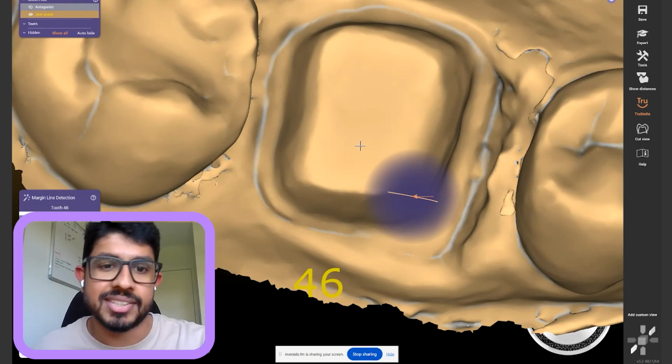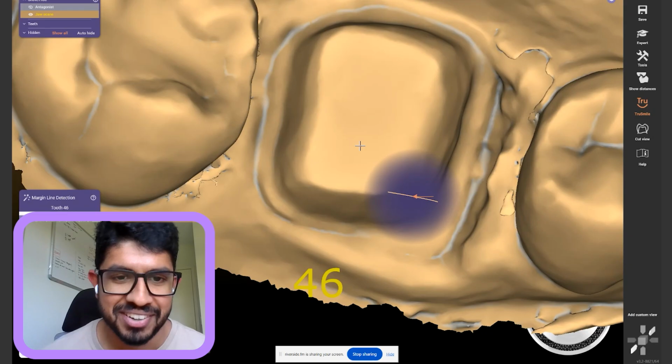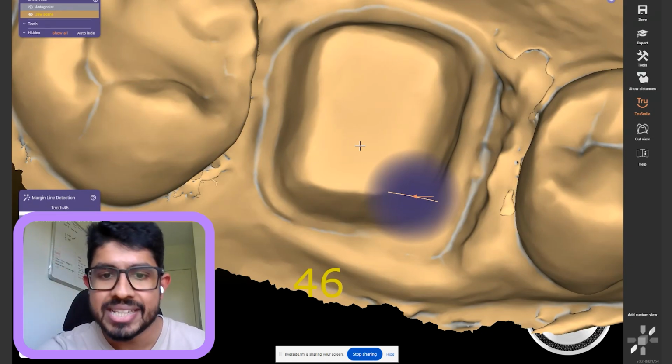I think that's why I have glasses, because I used to keep looking at the screen and trying to figure it out. Yeah. But so this is an STL file.